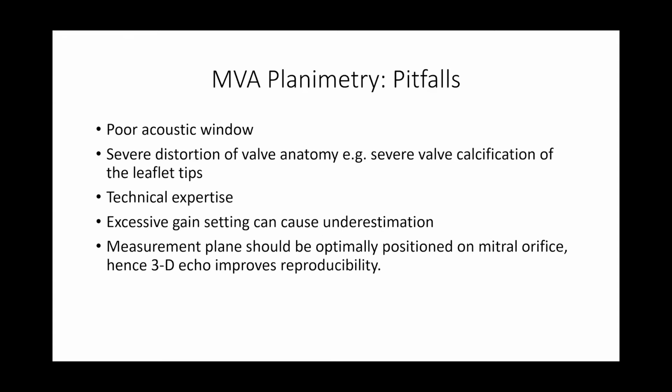The other thing is that mitral stenosis is not very common, and we don't see it very often. So technical expertise is a problem, because we don't do planimetry on a routine basis. And you need to optimize your gain, because if you're overgained, then you can underestimate the area. And the 3D aspect we already discussed.